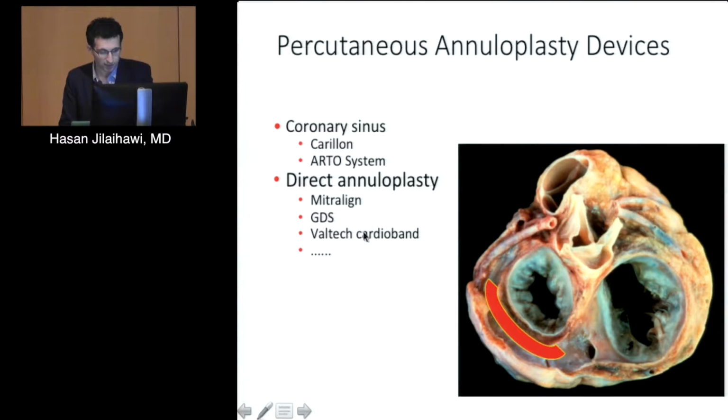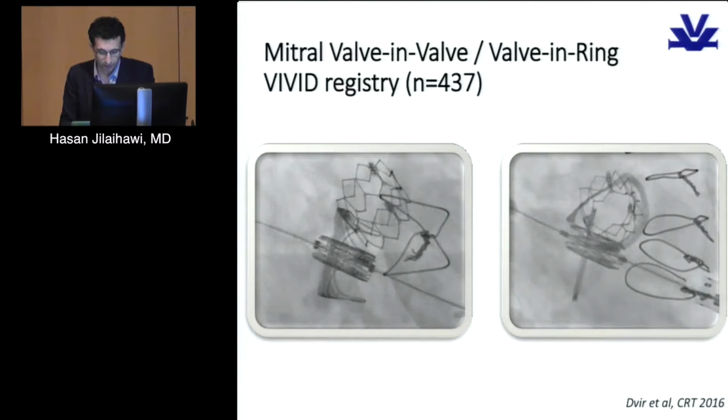We have to better understand how we can select such patients, but one of the things noted early on was that the coronary sinus can have the circumflex artery track in between it and the mitral annulus in some patients, and this is important to exclude. This can be clearly noted on CT.